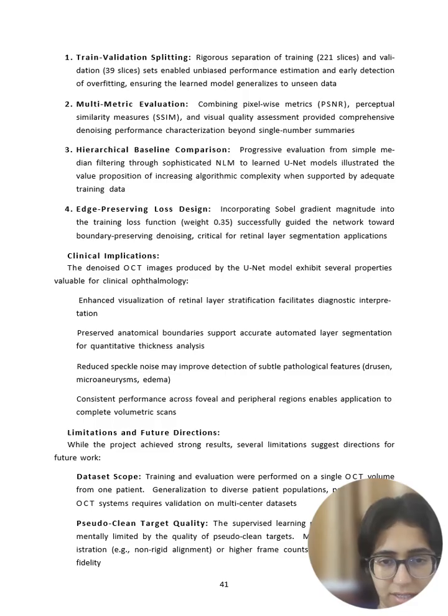Then we can look at the clinical implications. The enhanced visualization of retinal layer stratification facilitates diagnostic interpretation, and preserved boundaries support accurate automated layer segmentation for quantitative thickness analysis. Reduced speckle noise also improves detection of pathological features, and consistent performance across foveal and peripheral regions also enables application to complete volumetric scans.